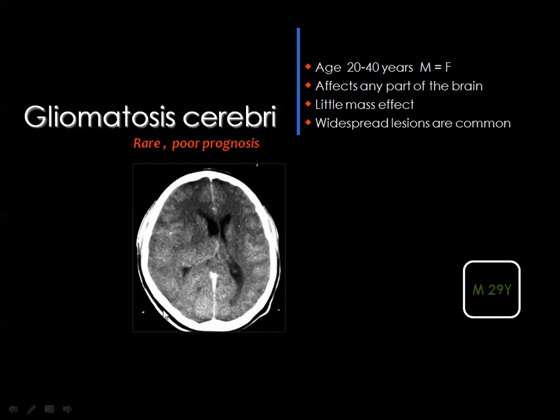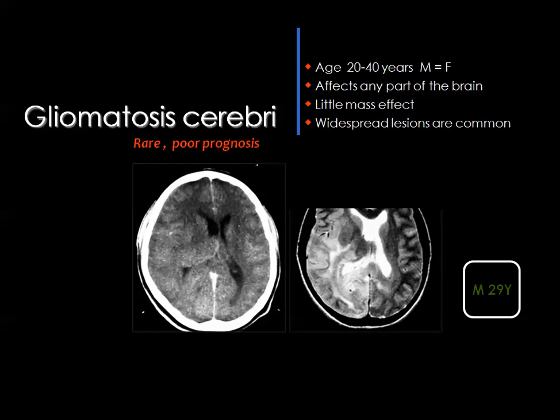And here you see in this area there is compression of the lateral ventricle, but you cannot differentiate the gray or the white matter. Look at the frontal lobes bilaterally, you can see the white matter and the gray matter. But in this particular area, you cannot see the gray-white matter differentiation because they are totally infiltrated by the tumor. But if you have the MRI images, especially the T2 and FLAIR-weighted images, you can see the infiltrative character of this tumor compressing the adjacent ventricle.